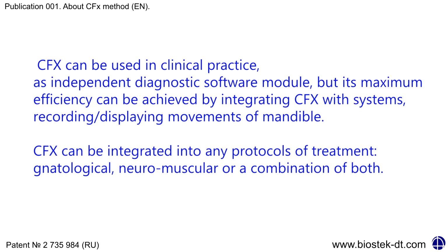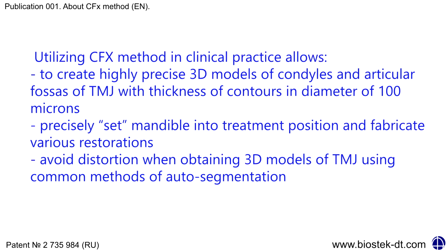CFX can be integrated into any protocols of treatment, gnathological, neuromuscular, or a combination of both. Utilizing the CFX method in clinical practice allows to create highly precise 3D models of condyles and articular fossas of TMJ with thickness of contours and diameter of 100 microns. Precisely set the mandible into treatment position and fabricate various restorations. Avoid distortion when obtaining 3D models of TMJ using common methods of auto-segmentation.